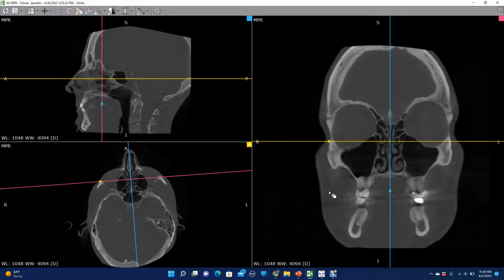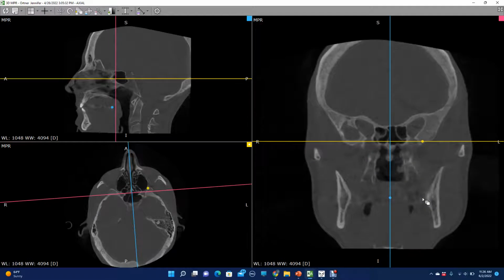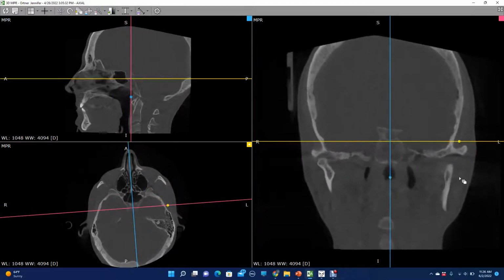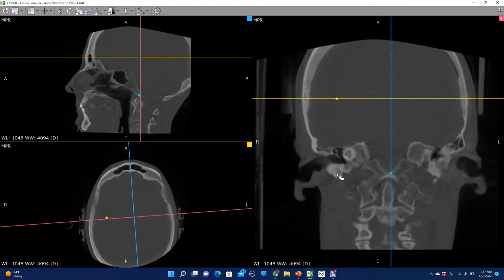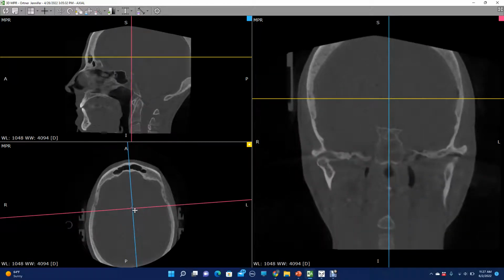And when we do this, we're not just taking the rotation out of the frontal, but we're establishing the horizontal cranium line. Because if this is unrotated, this should go straight through the middle. And so now I roll to look, are my other parts of my skull appearing symmetrically? Are my jaws coming into view at the same time? And pretty good. Are my inner ears coming into view at the same time? And here it is, and pretty good. So I think this is the best horizontal cranium I'll be able to get, and this is an unrotated frontal.